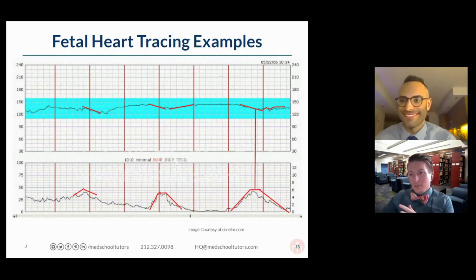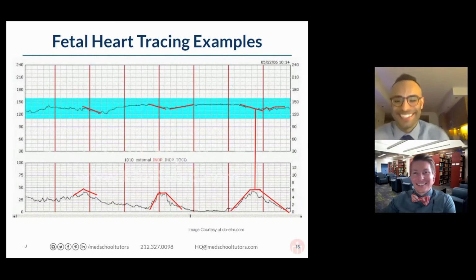So I'll ask you a fair question now, everybody. What is causing an early decel when it's happening? I see one good answer already. All right, Mario, Matthew, you guys got it? Nice. This is making me happy. All right, cool. So we got at least 3 people saying we got head compression.